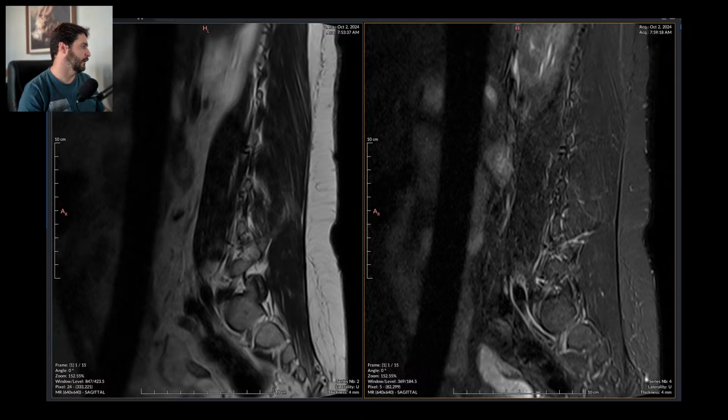It isn't a major deal. So this is an MRI scan of the lumbar spine. It's a female patient, 63 years of age. And of course, she has some kind of lumbar pain. Let's see if I can get any kind of clue on the motive.